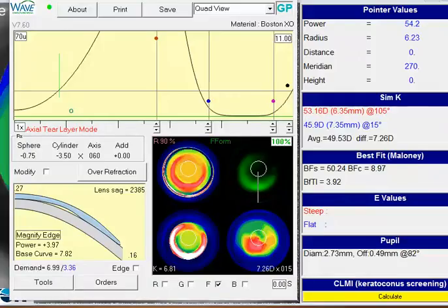I see from your request that you're struggling with optics on this keratoconus patient. Well, these can be some of the most challenging cases just because, as you recall, with these keratoconus patients, basically all the rules of the optics tend to go out the window. So you kind of have to fly by the seat of your pants sometimes. With that said, if we look at your design, overall your design looks good.